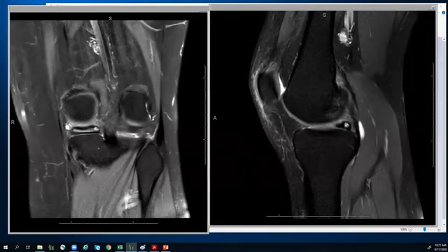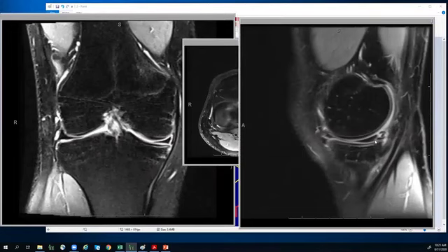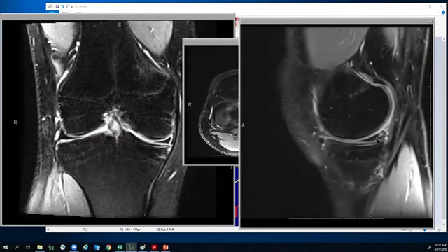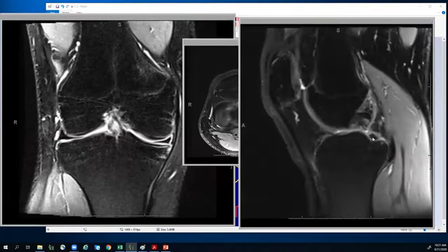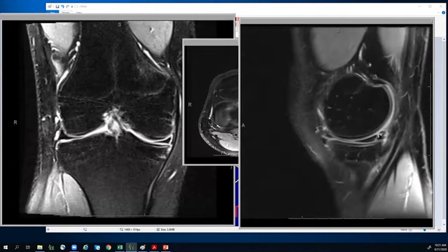All right, so moving on to another case example. So we have this patient. I'm in the sagittal plane. Here's the posterior root attachment. As I'm coming back from the posterior root attachment, I'm encountering this abnormality right here. I'll ask the chat again to, within the next 30 seconds, give some attempts at diagnosis for this abnormality.